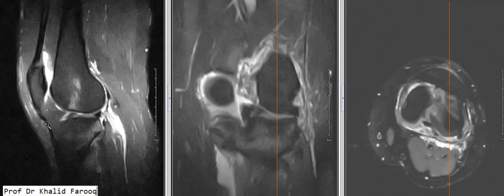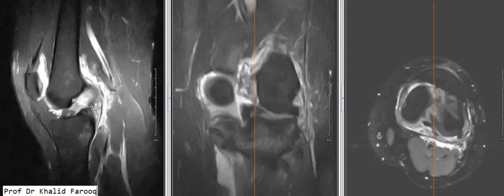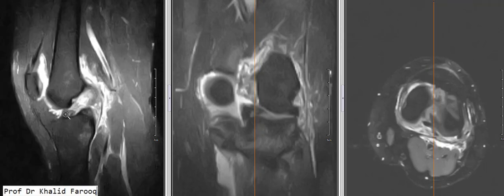This is quadriceps tendon and patellar tendon, both show normal signals and morphology. Joint effusion is noted in suprapatellar bursa, and this is lumpy bumpy anterior cruciate ligament with extensive injury. We cannot see normal appearance as is noted in this posterior cruciate ligament. No signal abnormality appreciated in it. Its borders are smooth and sharp, but when we see ACL, it is presenting a pseudomass appearance suggesting total transection.